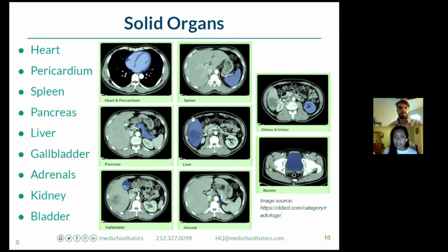here. Here we have the liver, as I mentioned. This liver has a nice, huge hypodense lesion in it, which we will just ignore for the time being. But this is the normal appearance, normal location of the liver, I should say. This here, gallbladder. Gallbladder has a couple stones in it, right? You see these large calcified objects here. This one has quite a few stones.